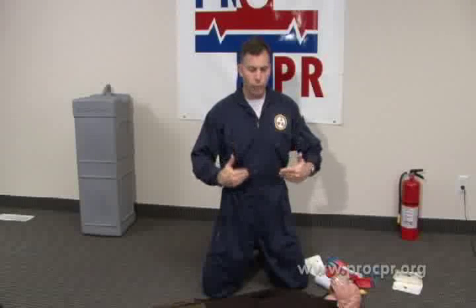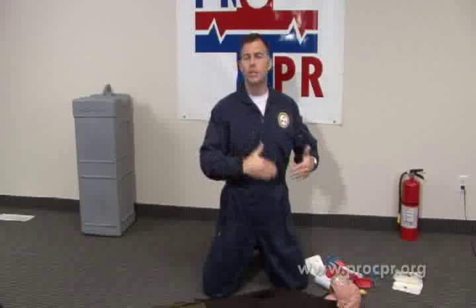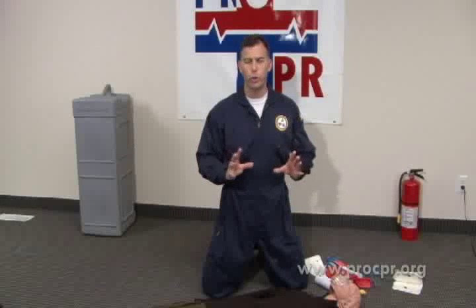AED. For the sake of this training, the whole scenario is going to be based on a witnessed cardiac arrest to save a little more time as we demonstrate how to set up the AED, how to apply it, and then how to actually run an AED protocol.